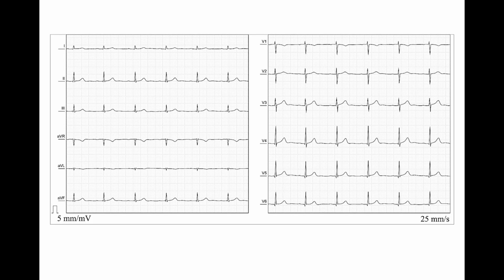Usually the QRS complex amplitude is highest in the precordial leads. If the QRS complex amplitude is high only in the precordial leads, the limb leads can be recorded at normal sensitivity and the precordial leads at half sensitivity. It's important that the amplitude of all ECG waves is reduced twice. For correct calculation, the number of squares characterizing the amplitude of the ECG wave should be multiplied by 2.